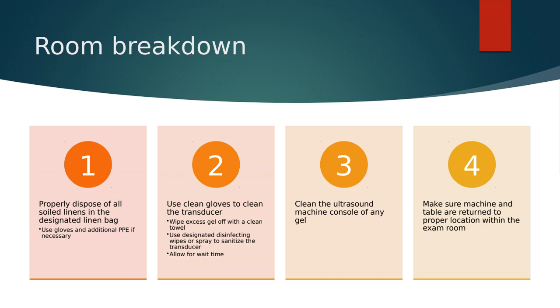We need to use clean gloves to clean the transducer. So what I like to do is I put just one glove on one hand and I clean out all of the soiled linens into the linen bag. And then I use another glove on my other hand to clean the transducer. You want to make sure that you're not wiping the transducer down while it has massive globs of gel on it, because that's not going to clean the transducer. So wipe off all the excess gel with a clean towel, not the towel that the patient used.